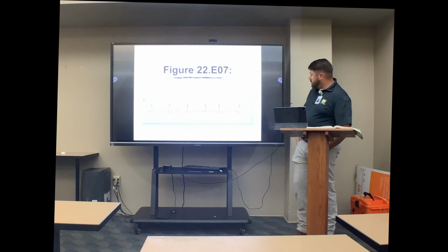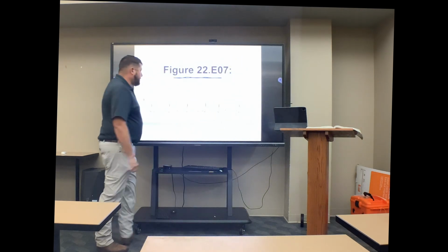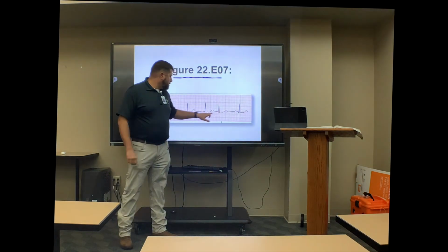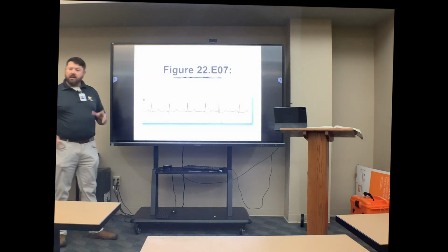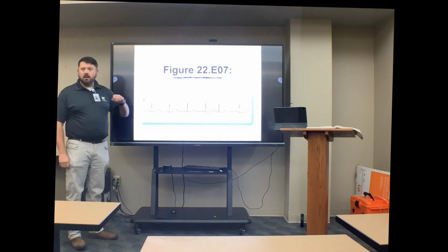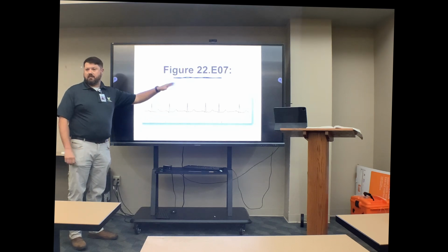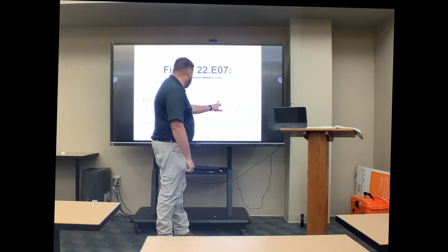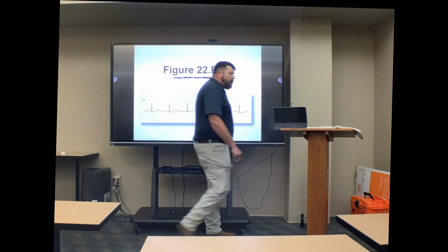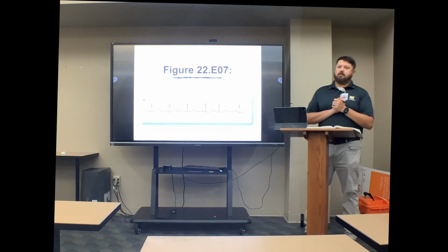Same thing here. That's funky. Almost looks like a set of lips, don't it? And we'll see when we get into atrial abnormalities with 12 lead, we'll see what causes that. But right now, what we're just looking at is, are the P waves, they look the same. And they do. But where's your P wave here? You ain't got no P wave. All right? Any questions?